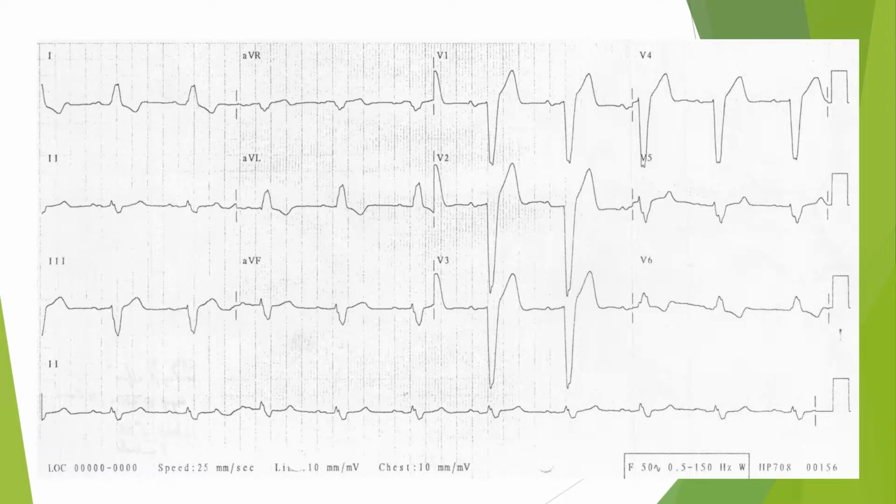Okay, here's another example. This is a left bundle branch block here. If you look in the anteroseptal region, you have significant elevation, or what you would perceive to be clinically significant elevation, and if this patient had chest pain, you might activate.